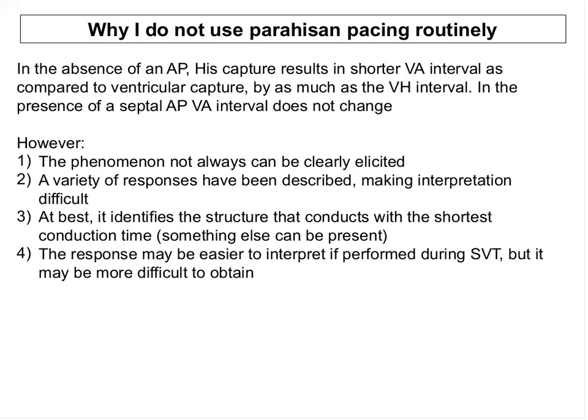And finally, the response, as with the previous maneuvers, is easier to interpret if it is performed during SVT. However, the catheters are also less stable during SVT, and the maneuver is more difficult to be elicited during SVT. So, again, this is a trade-off.